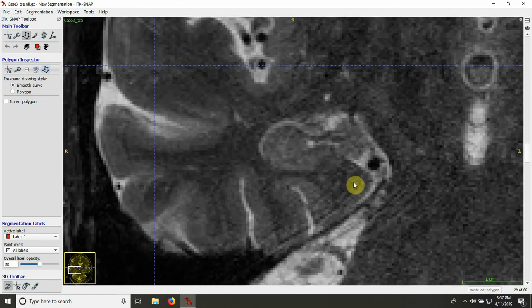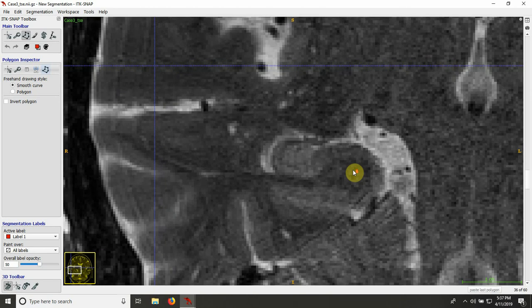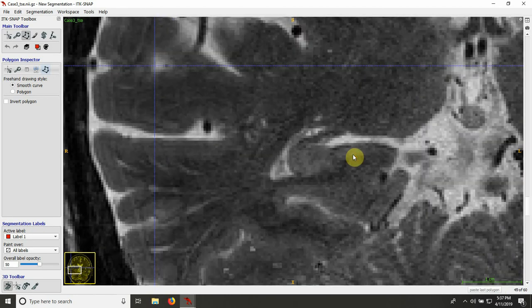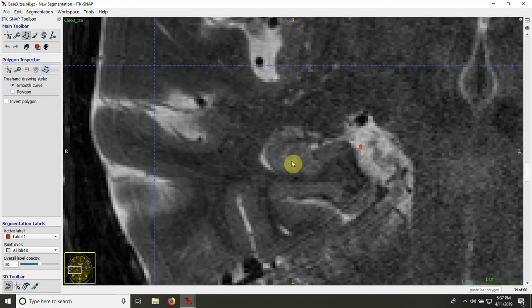So given that I see now quite a number of slices where I'm not 100% sure, I would probably also exclude the hippocampus. Even though there are actually some body slices where you can see the outer borders, but also the dark band pretty well. As I mentioned before, the hippocampal body generally looks better, so there are generally some slices where you can see something, but given how bad the hippocampal head looks, and that's something that I do segment, I would exclude this for hippocampal subfield segmentation.